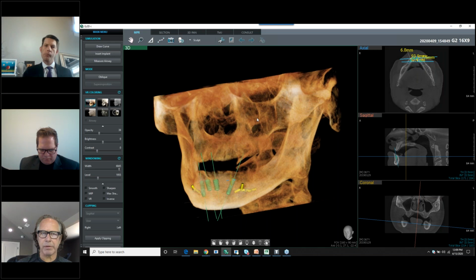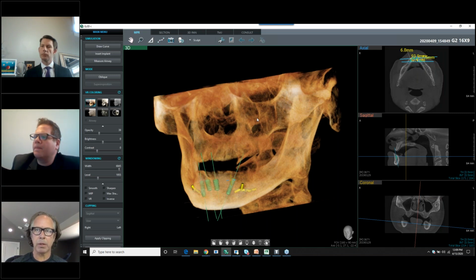Yeah, I prefer the bigger view myself. Can you accommodate it with an 8x8? Certainly, but I want to see the big picture. When I'm doing full arch or full mouth reconstruction, I just want to look at everything. To me, it feels more comfortable. Now, I do want to reiterate that an 8x8 will do it. If you don't mind looking at a smaller FOV, or field of view, the 8x8 will accomplish it. You just won't see things like the TMJ joints, and you'll be limited in space, but it's doable. But again, being a surgeon, I would prefer to see the whole view myself.